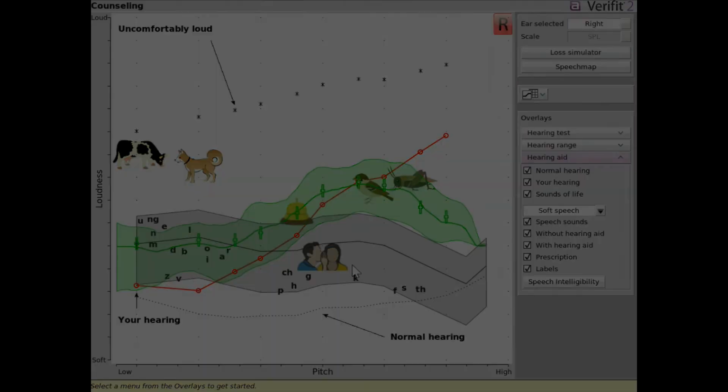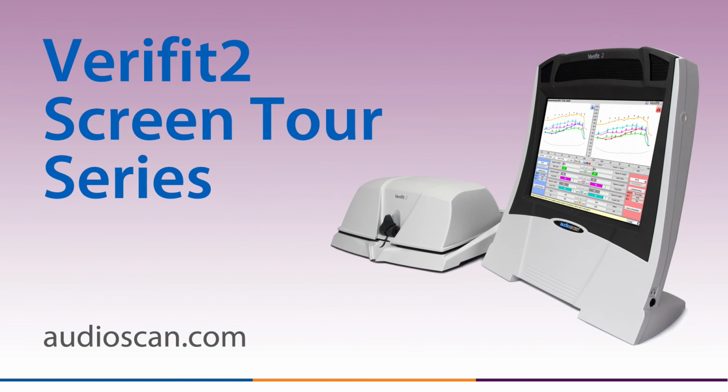For more information on counseling in SpeechMap, please refer to the Verifit2 user guide.